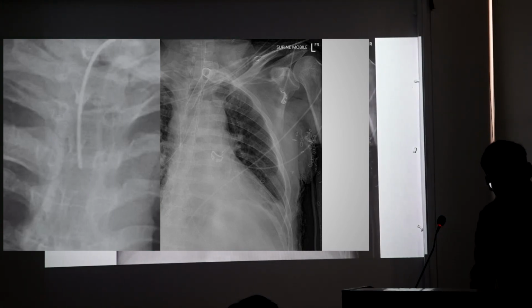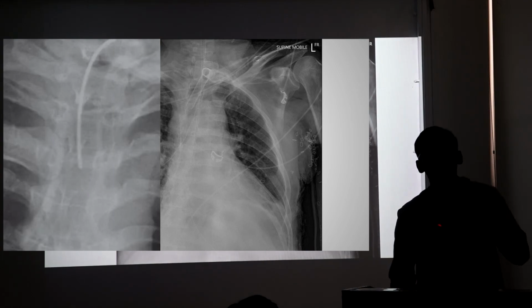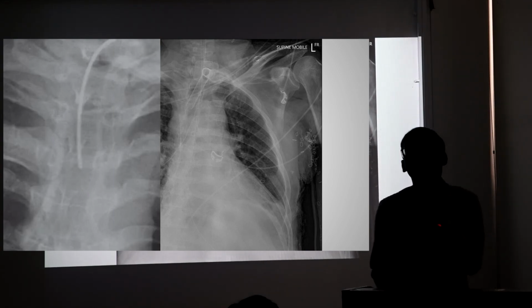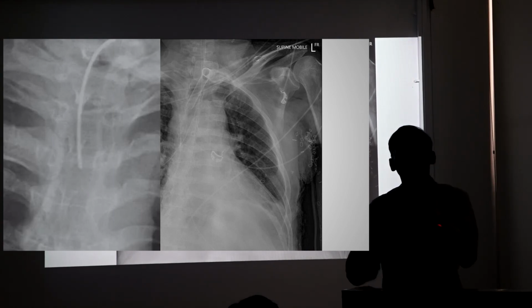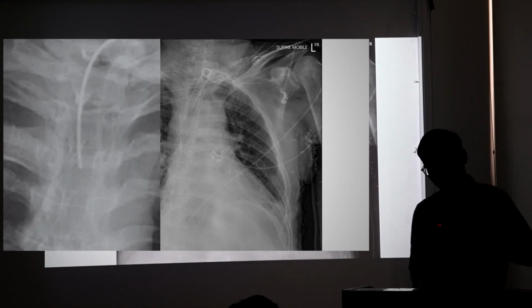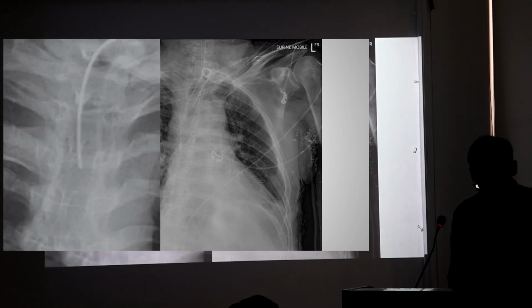So this is a tracheostomy I have told. So what is the exact position where the tracheostomy tube should lie? From the stoma to the carina, and there is a tip of the tracheostomy in between. So the tip should lie almost midway between the stoma and the carina.